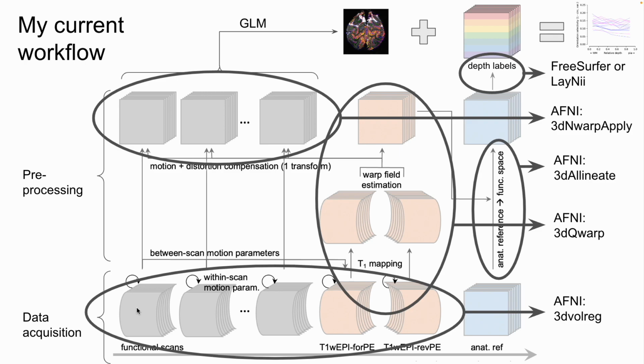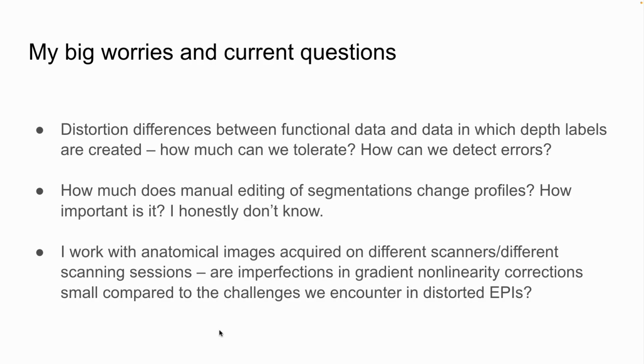It can find alignment between high contrast features just fine, but for shifting around signal where the contrast is low, why would any algorithm succeed when there isn't a visible gray-white boundary? So that's the hypothesis. That's why I'm using this T1 weighted EPI to guide distortion compensation instead of the regular old functional data. Is it a meaningful difference? I don't know yet. It was fun to try, and so that's what I'm sharing, but it might not mean that much. And neither is doing a perfect job.